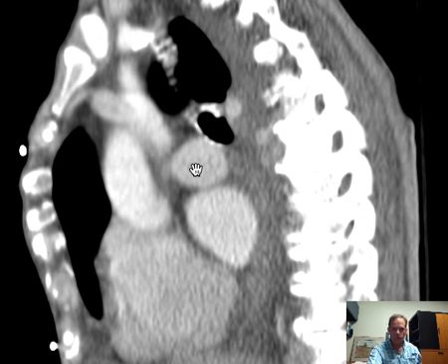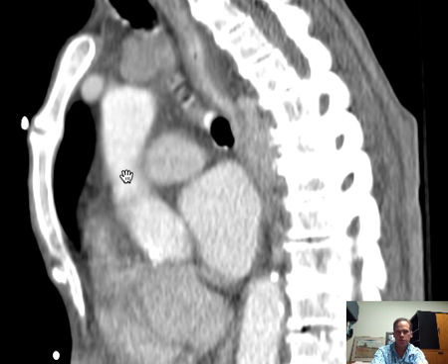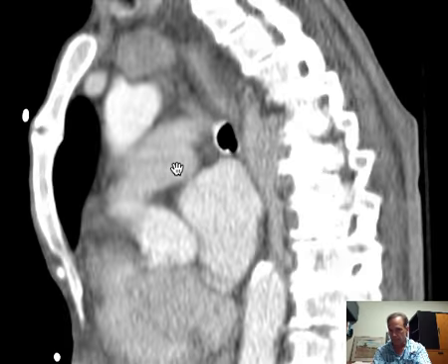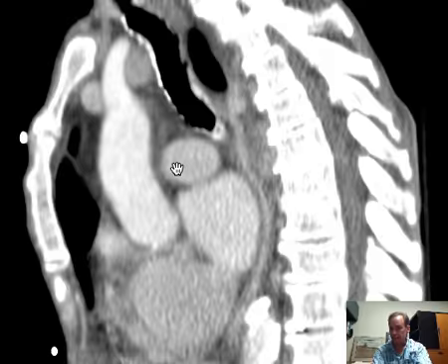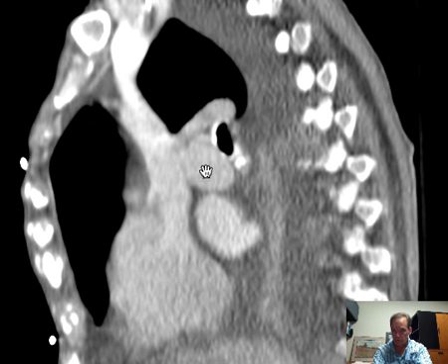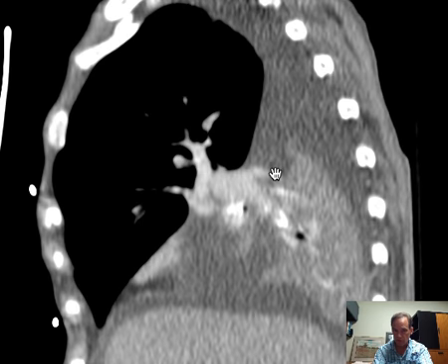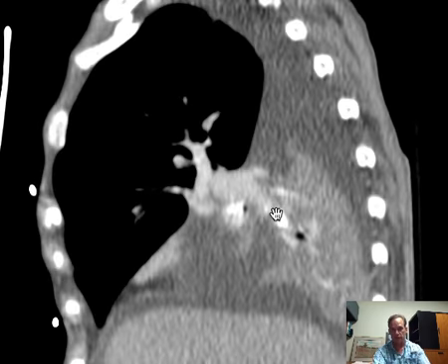It's a big vessel. This is a big vessel. In fact, if you look here, it's almost as big as the thoracic aorta. Right here it does have the same diameter as the thoracic aorta, the main pulmonary artery. And it shouldn't need to have as big a diameter because, of course, it doesn't have nearly as much flow. Or it's not under that kind of pressure. So let's take a look. So here is the right main pulmonary artery branching and going off into the right lung. And here you can see a branch from it. Let's see if you get a little feeling of it there. Okay, there's a branch. There it is branching.